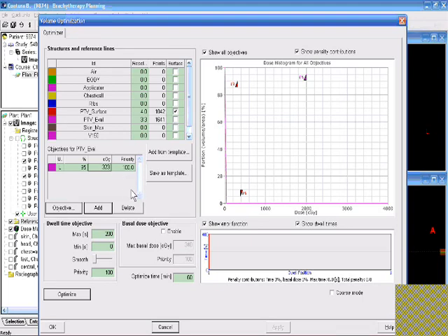That's fine. Now for the V150 and V200, we're going to put them on a different volume now. So we'll just add them one by one. This is on the V150, and we're also doing it on volume, not surface. So we'll add one here. And so for our V150, we're going to set 19%. And the dose here is going to be 150%, which is 510.